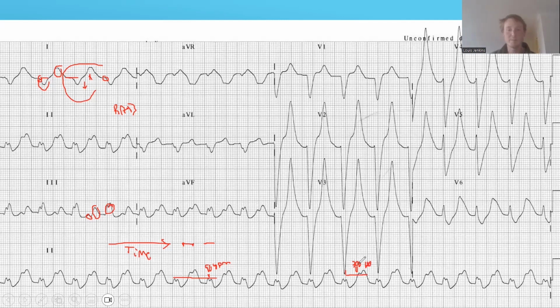You can remember that because it's half of 300. And then if we come across again, it's going to be 100 beats a minute. We can remember that because it's a third of 300. Yeah, 100 beats a minute. Sorry, brain fog. And then if we come across again, it's going to be 75, and you just have to remember these numbers. There's probably ways to do it, but I just kind of remember them. And then if we come across again, it's 60.